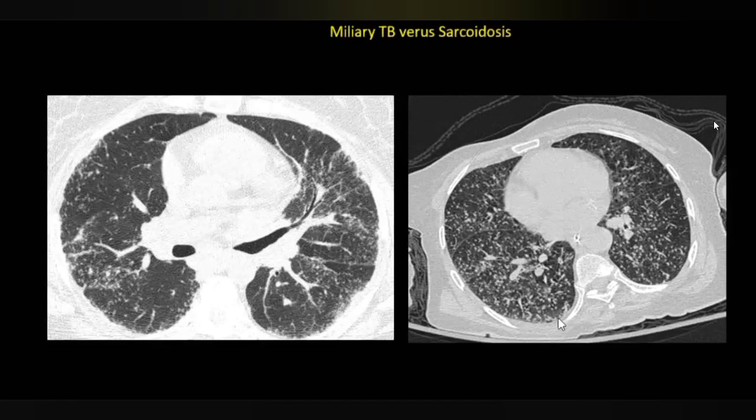If the surface of the pleura is involved, then this is not centrilobular, because in centrilobular the center of the lobule should not be in the surface of the pleura. It should be in the center of the lobule. So here you see involvement of the surface of the pleura. True, correct? Yes, sir. So this indicates that this is not centrilobular distribution. Then the next step, it is either random or perilymphatic. Are the nodules exclusively involving the perilymphatic route? No. So you are ending up with one distribution, which is a random distribution. Okay?